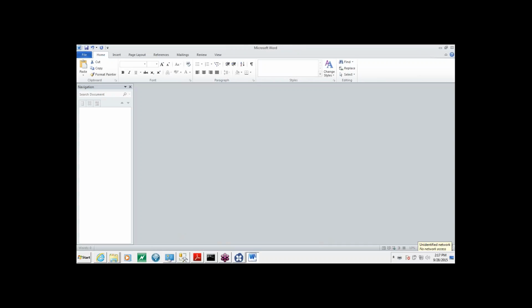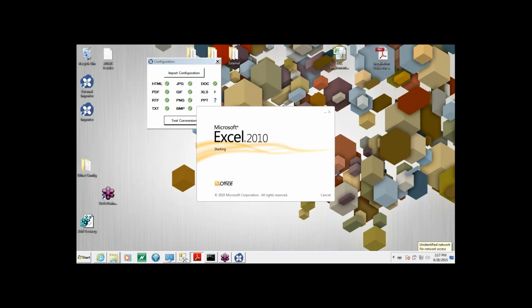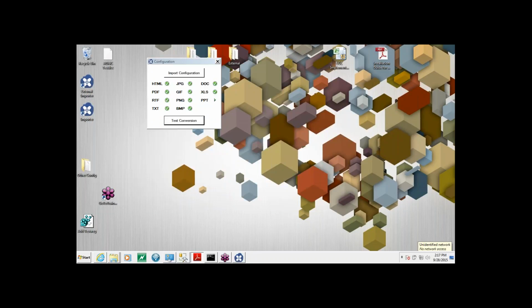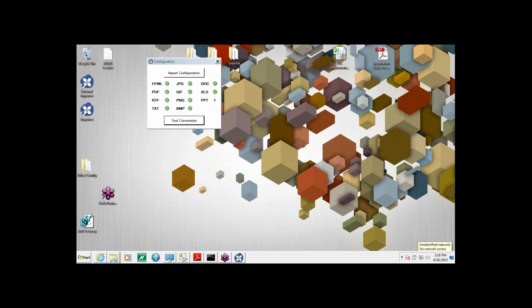Another item that you may want to be aware of when running the test is that, for example, if the tool asks you for information, like accepting a license for Adobe or this kind of process, you can always do it as is testing and retest again just to make sure that there is no issue.